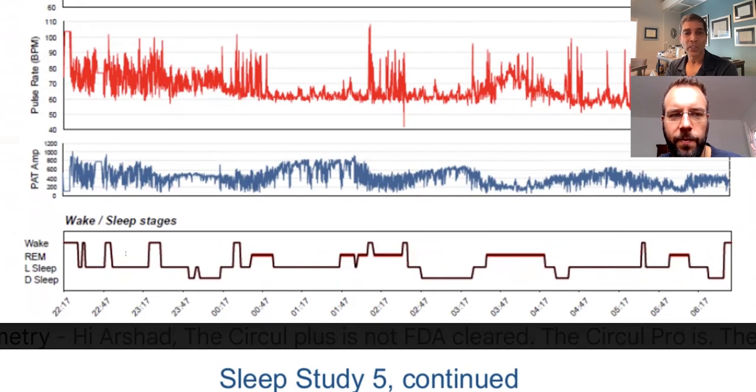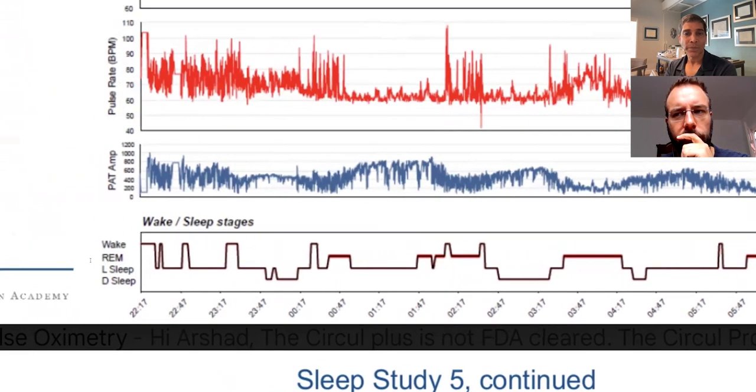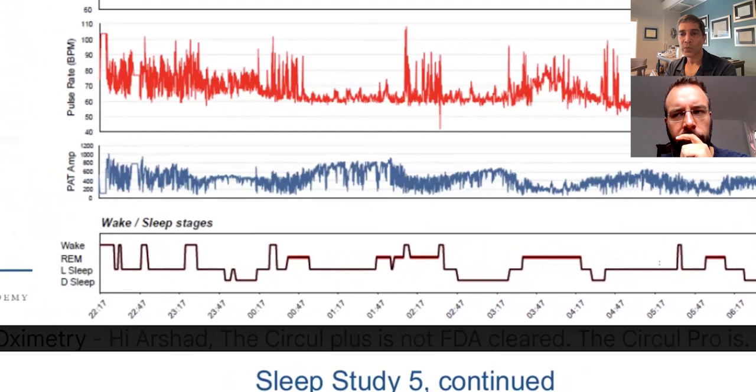But anyway, 1, 2, 3, 4, 5, 6, 7 times versus 17, the last person, right? And then how many of them woke them out of deep sleep? 1, 2, just 2. I got a question. I got a little side question for you.